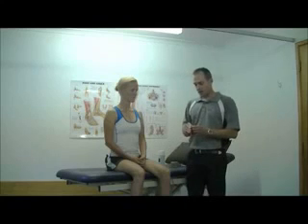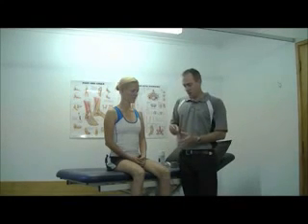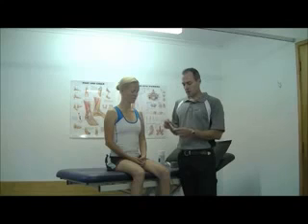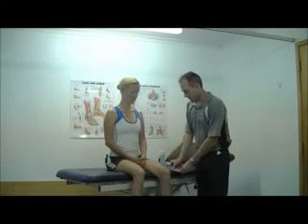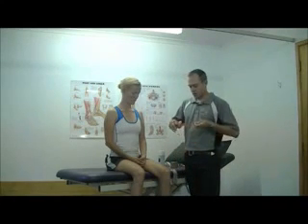Dynamic tape is a highly elastic tape. The idea being that it will permit full range of movement, unlike your rigid sports tape. So we can see that it's highly elastic and stretches in both directions. This makes it very conformable, and it means that you don't limit movement in a secondary direction due to the lack of stretch.